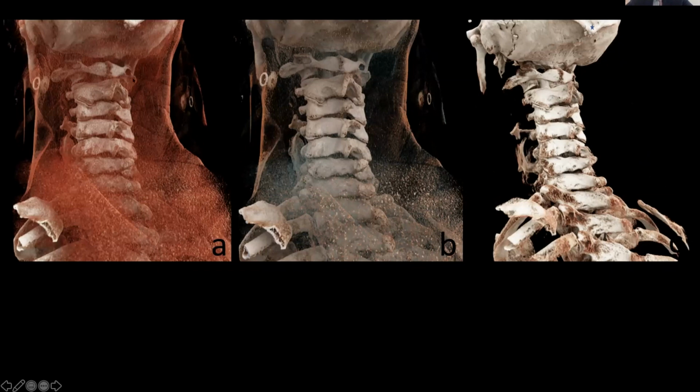So what I wanted to show you here is, again, looking at a dorsal projection. This really shows you the posterior elements really well. You can see the spinous processes. You can see exactly what they look like. You can see if potentially there was an incomplete spinous posterior arch at a certain level, as we sometimes see congenitally.